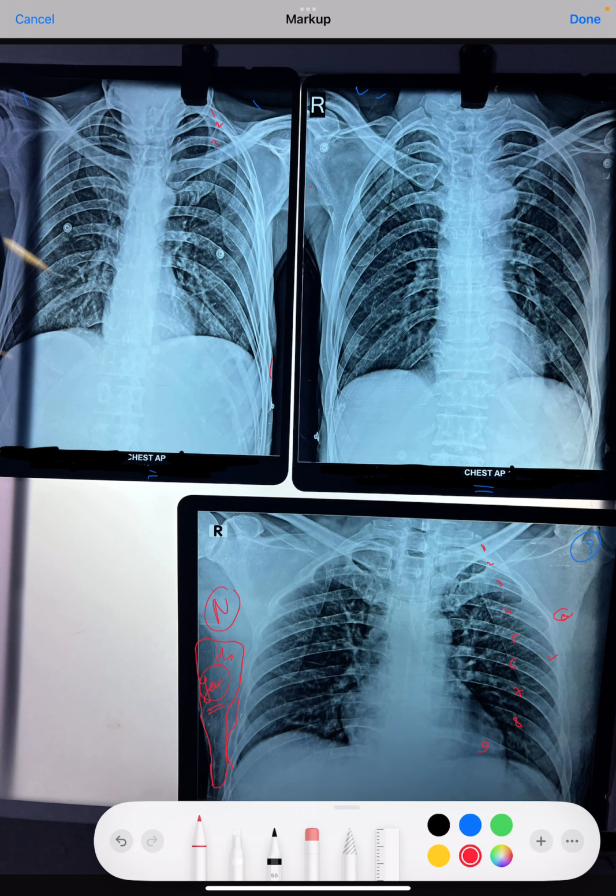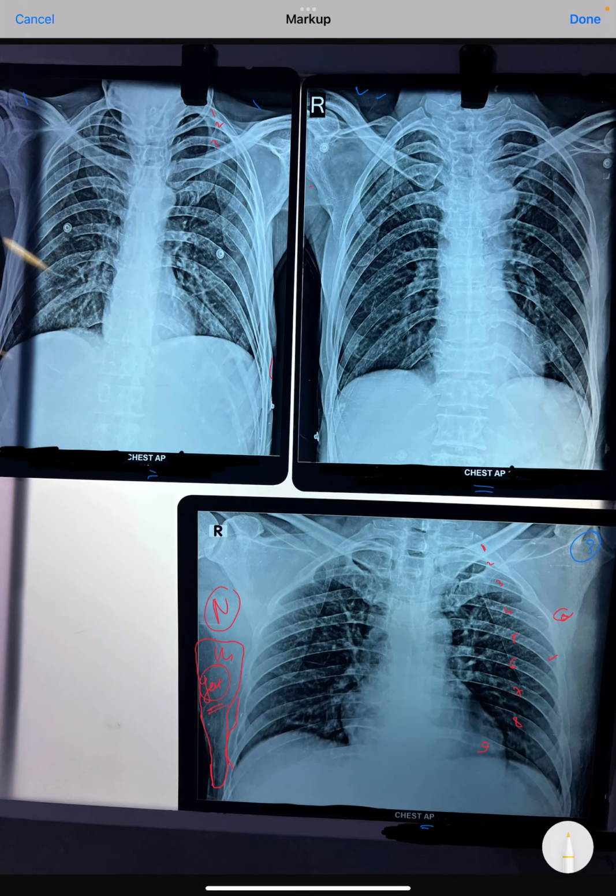Another very important thing is the tubular heart. Just see the heart. Because of the significant hyperinflation of these lungs, they compress our mediastinum as well as the heart. That is the reason why the mediastinum and heart appear more tubular. They are more completely straight. Here also it is the same. The mediastinum and the heart are in a tubular form. It is all in tubular form.